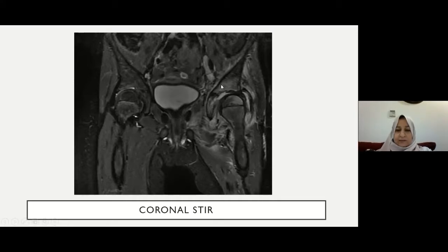Around the triradiate cartilage here in the pubic part of the pelvis of the acetabulum. This is the focus of infection, and it is typical for this flat bone of the pelvis to have mild bone affection, contrasting the very big soft tissue involvement, so don't misdiagnose it as cellulitis or septic arthritis.